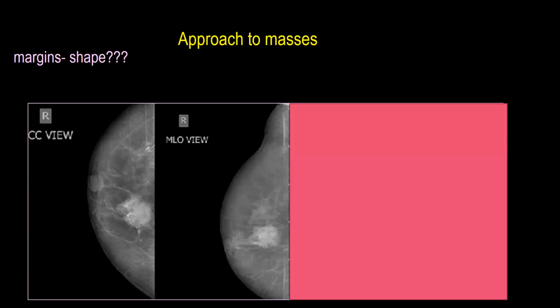Microcalcification. Calcification. And what else? Edema. Look for this band going to the nipple. Nipple retraction. Okay.